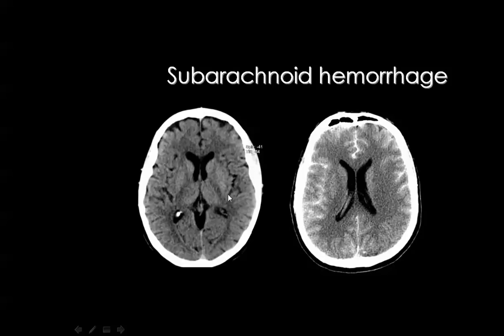And you know, the normal CT brain will show the ventricles on either side of the midline, and the cortical sulci on the surface of the cerebral hemisphere, and these cortical sulci are usually filled by CSF, and CSF is hypodense, as you all know.